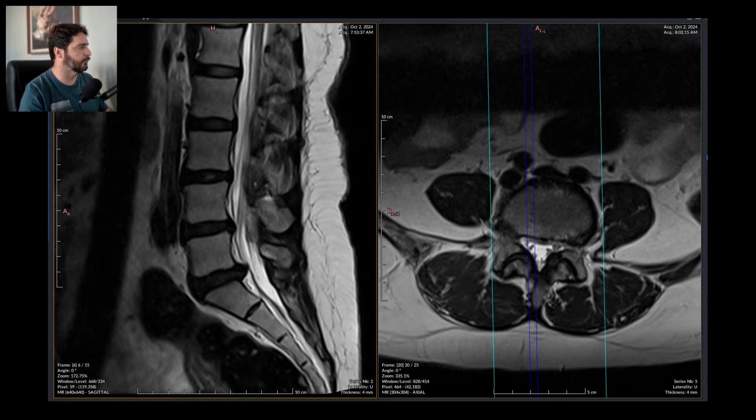They still need someone to report them. So it's done. We have one. There is another cervical spine scan.